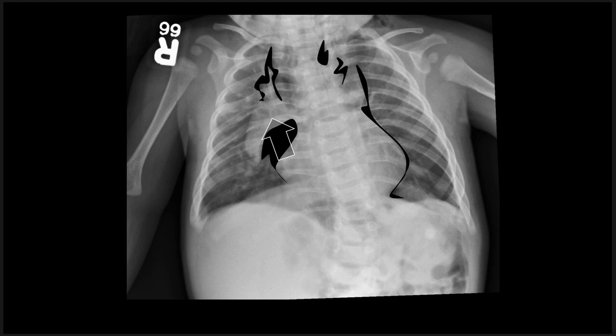And this is one of the situations where, earlier, the thymus can cause a lot of confusion and be a hindrance because it's scary, especially when you're first starting out looking at these things. Try not to call it a mass. Here it's actually useful when it's elevated because it helps us identify that this kid indeed has some abnormal mediastinal gas. Sure enough, a little bit up there in the neck as well.